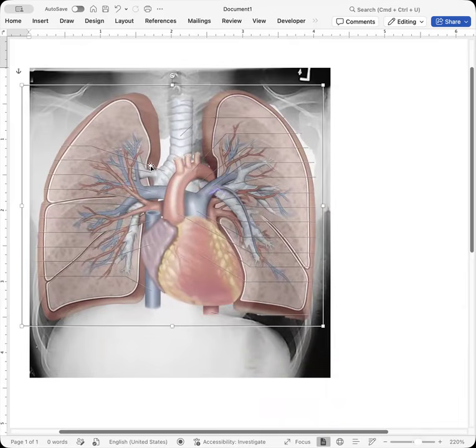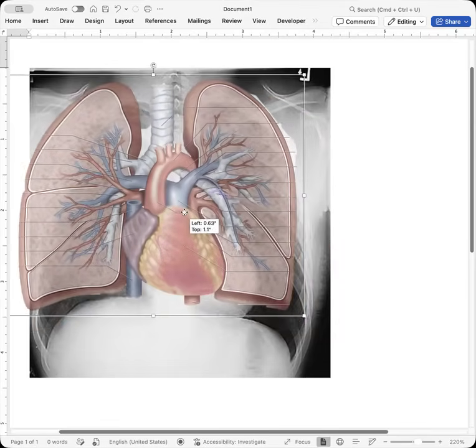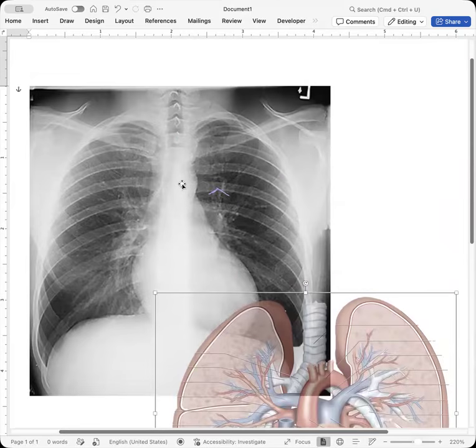Also, this area here where the bronchi are entering and exiting, the vessels and so on, this area where everything enters and exits is going to be the hilar region. And so we see that around here in this chest X-ray. Also, here's the heart shadow. If we overlay this, we can see the heart shadow there. And then also the aortic arch, or on an X-ray, it's often called, sorry about that, an aortic knob. That's going to be here.